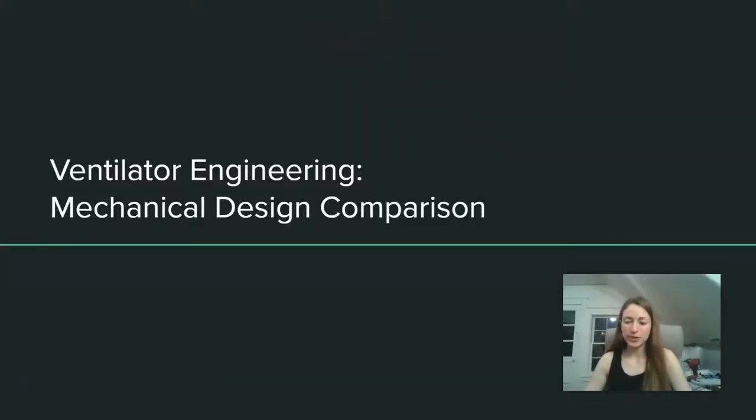Today's video is going to be a bit different from the last two in the sense that we're going to be looking at existing designs that are out there in the open source critical care ventilator community. Now, I'm not going to spend too much time looking into any individual design, but I do want to give people the sense for how to orient yourselves when presented with a new design and how to pick out details that may benefit you with your own projects.